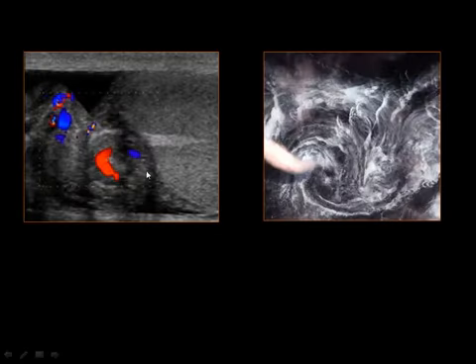This is a twisted spermatic cord. It is rarely seen like this. Enlarged twisted spermatic cord, superior and posterior to the epididymal head, containing a round anechoic structure representing a vein, resembling a whirlpool, and this was first described with MRI imaging.